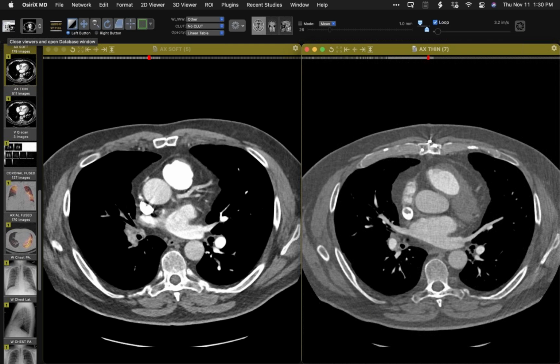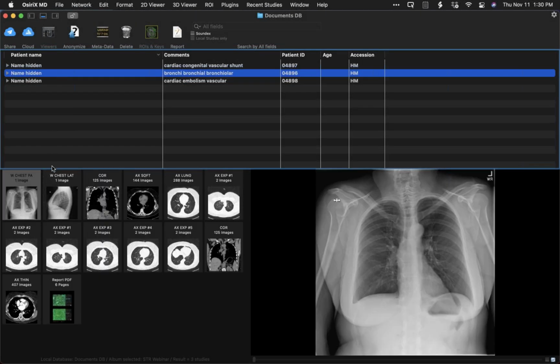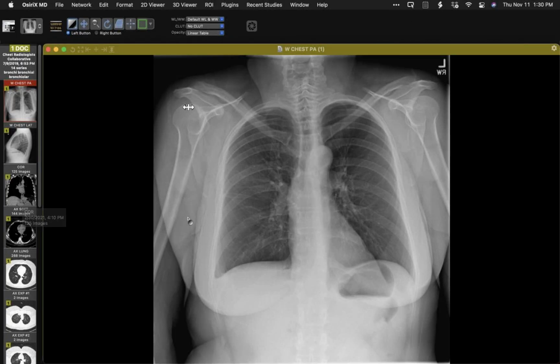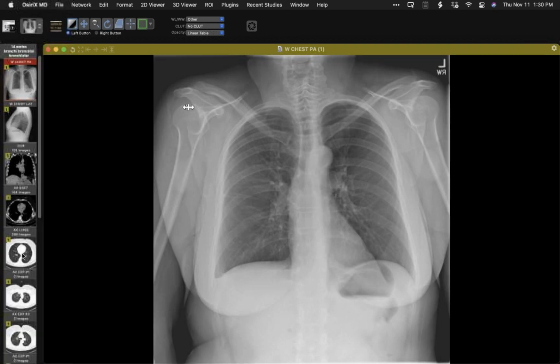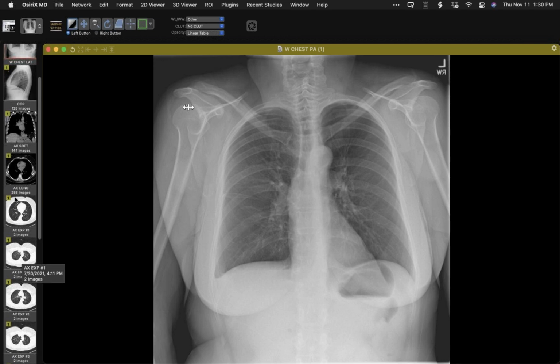Okay, I want to show you this really interesting case here. So I came across this case after the patient had gone to a surgical lung biopsy for ILD and a chronic respiratory illness. So I'm going to show you things a little bit out of order, but let's just start with the radiograph here. Really nothing much to see on that radiograph, but I want to show you, and this CT was read as basically negative.